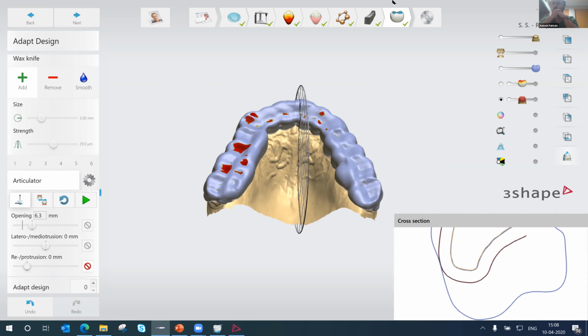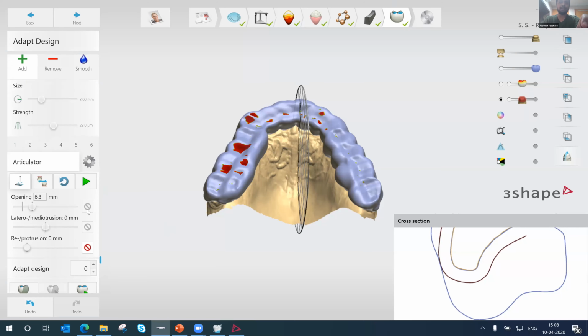I mean, you are feeling like whatever design you have made, you are printing some other design, and you are getting other positions than what you designed. No, it should not be like that. But maybe we can see a couple of cases of what exactly you have designed. Maybe after playing these motions, I don't know whether you're applying it or not. If you don't apply this button at that design, it will not take place.